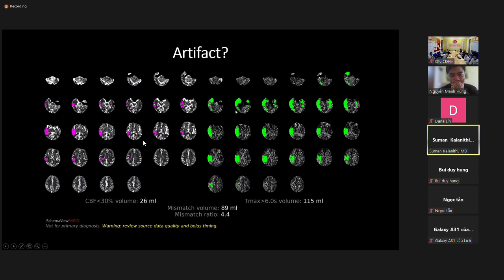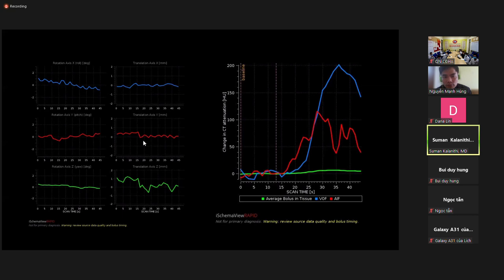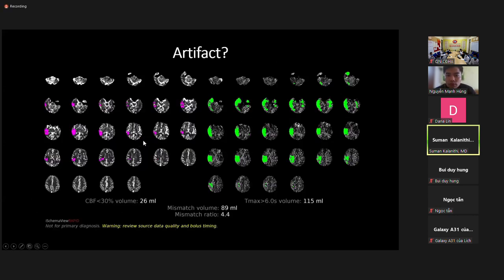But sometimes you will have a case that is in between, because you could say maybe they threw two emboli. Maybe they have AFib and they threw a clot here and a clot here. It's possible. Or maybe they have a chronic stenosis here and a new stroke here. So how do you tell? Hopefully, before you went here, you first went here, and then you can see this is a disaster. You look at this first and say this scan is bad because this curve is horrible. And then you look at this and say, I don't know what this means.